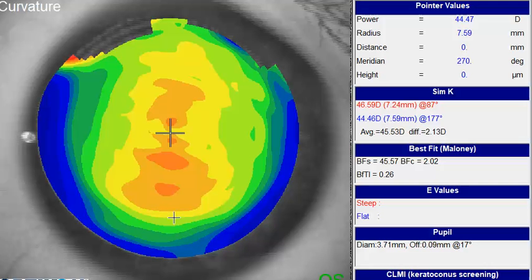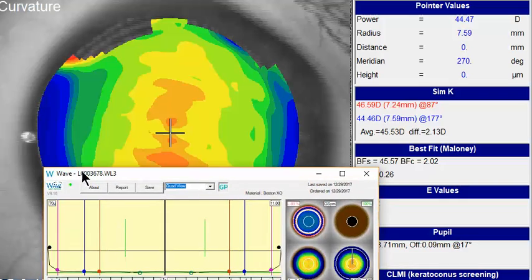So the key is trying to get this outer area to line up more closely. And so a couple things you can do. One option is, as you were going to try in your fourth lens, I believe, is to just make the whole lens steeper. That can certainly be helpful. Or the option, sometimes if I have a lens that is having a little trouble in one particular sector, I'll switch over to freeform to just get a little bit more alignment there.